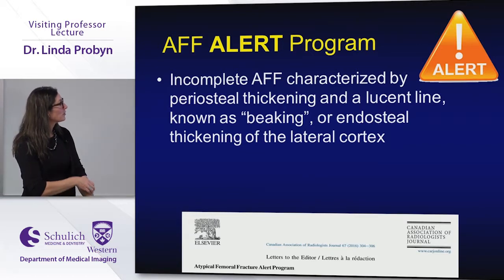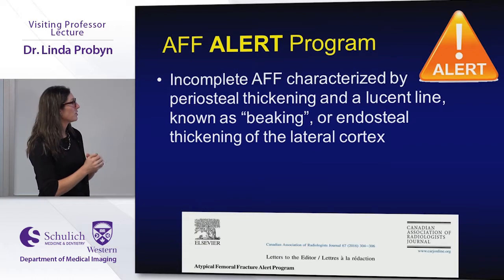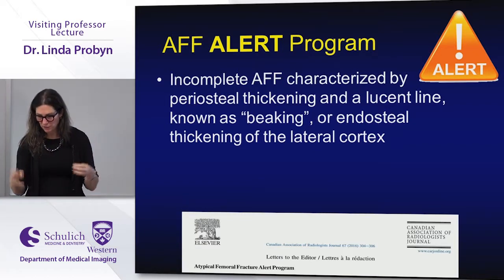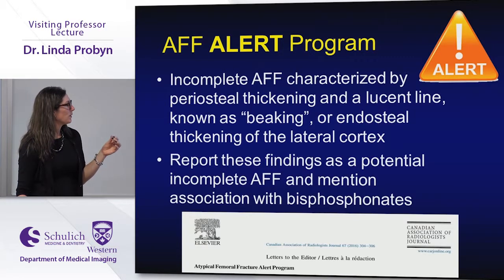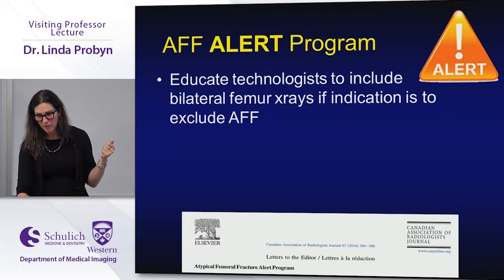Incomplete atypical femoral fractures are characterized by periosteal thickening and a lucent line, known as beaking, or endosteal thickening of the lateral cortex. We've already been through that, but that's how they would like us to make sure it is clear in the report. Report these findings as a potential incomplete atypical femoral fracture and mention that association. So they want that in there.